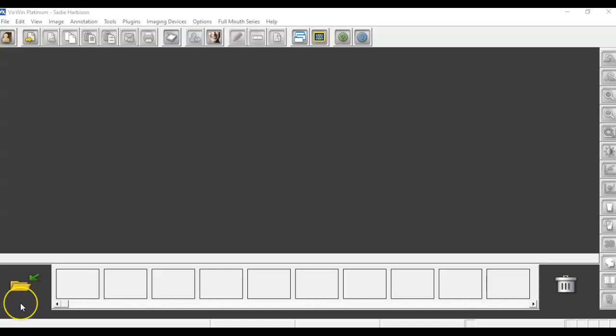Everyone, so I am in VixWin. From Axium, you select your patient and you select X-rays in the left column. I'm in here, but as you can see, there's nothing there. And VixWin had this issue last year. I had to go to IT and bring my computer and have them do something with the software so that I could actually see X-rays.